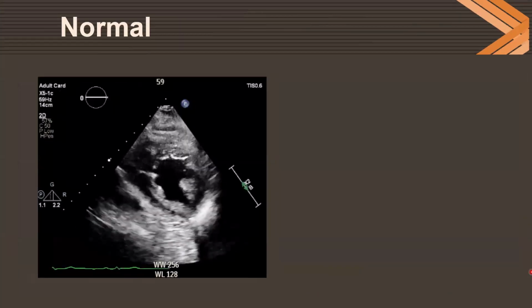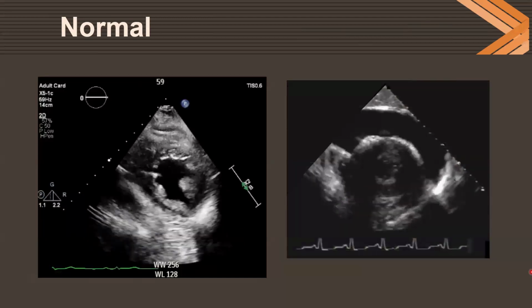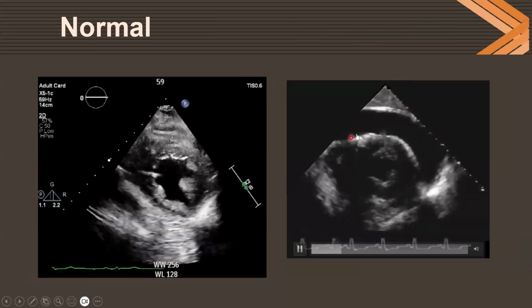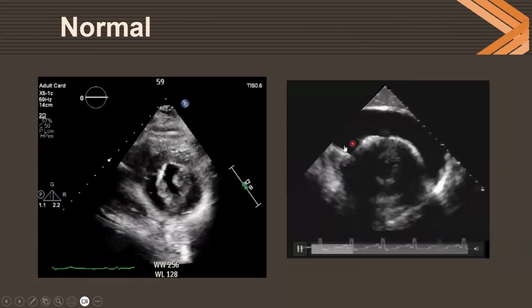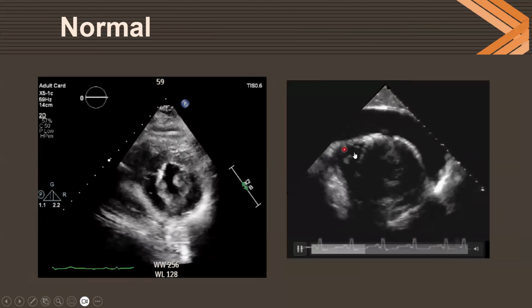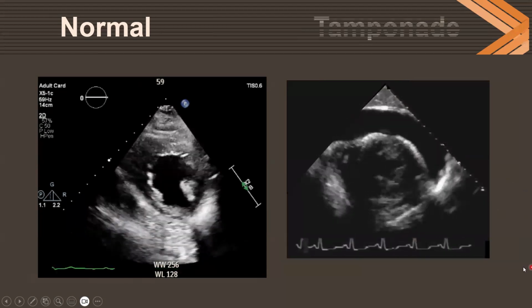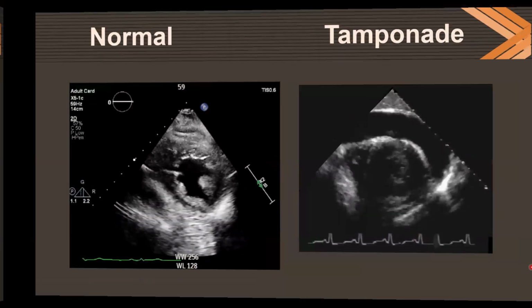And this is the normal short axis view of the ventricle, and you'll find here also a huge amount of fluid accumulating in the pericardial sac, and the right ventricle is collapsing with the pressure of this fluid, and this is also a diagnosis of tamponade.